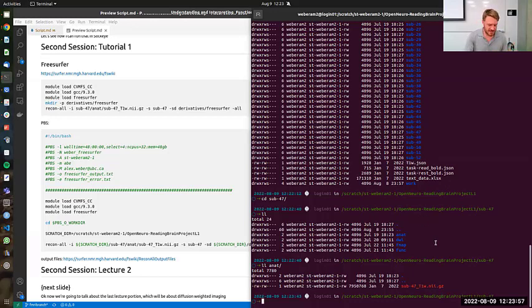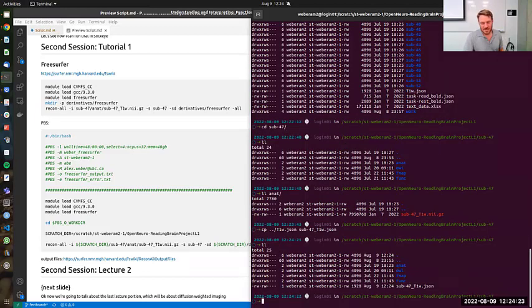So for my purposes, I would have to copy the T1 JSON. You're already in 47. Yeah, I'm trying to copy it. I wanted to name it like this. Oh, I see, I was not in the right folder.